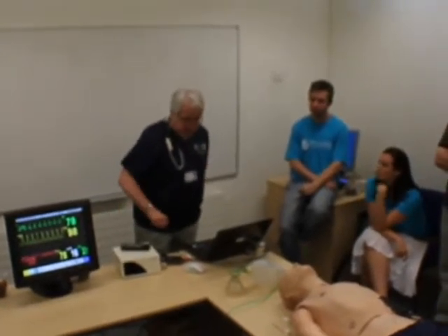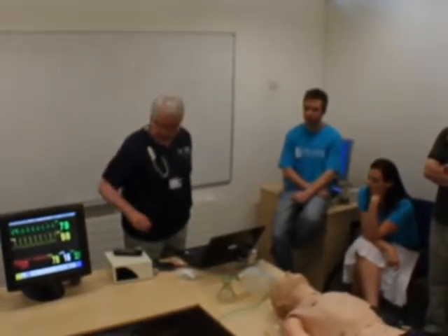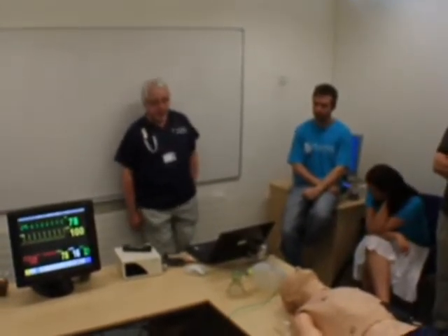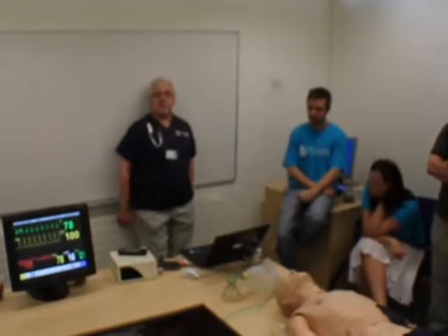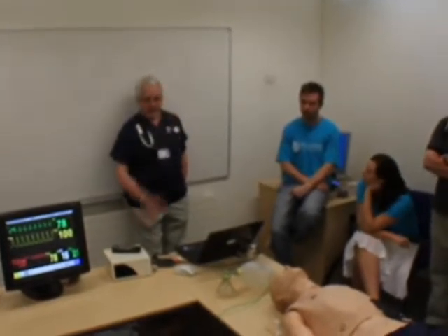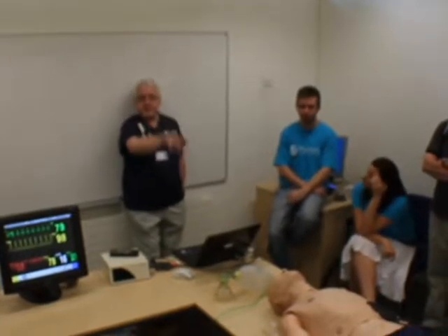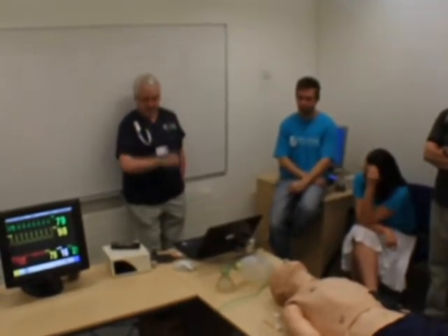Then we've got a blood pressure reading, another pulse. Next to that we've got in the white 16, that's his respiratory rate. And if you look, you will actually see that his chest rises and falls about 16 times a minute. So he can breathe, his chest moves up and down, and we can control how fast he does that.